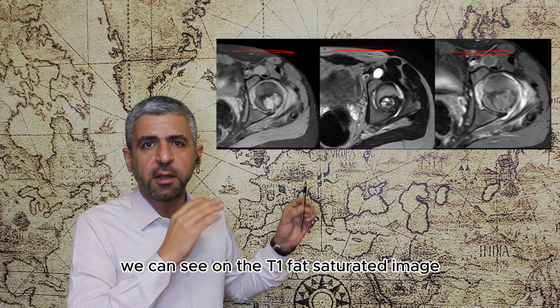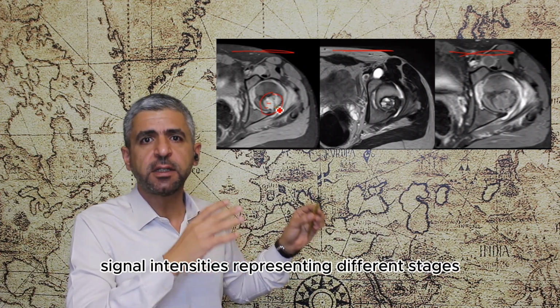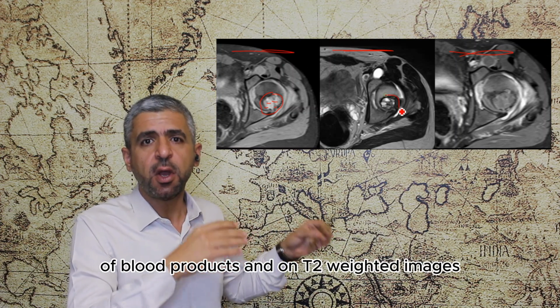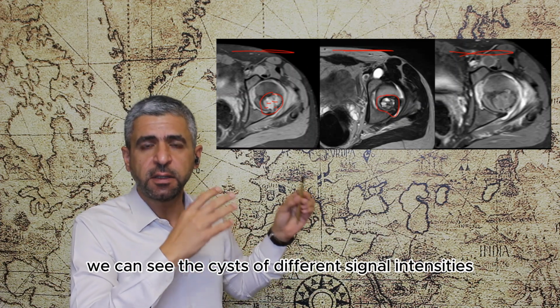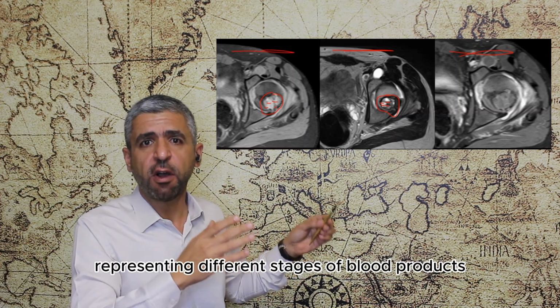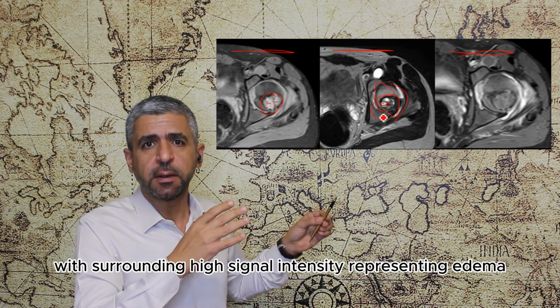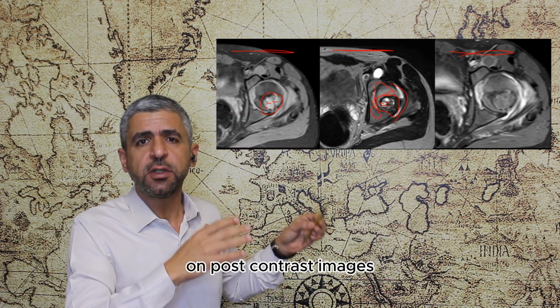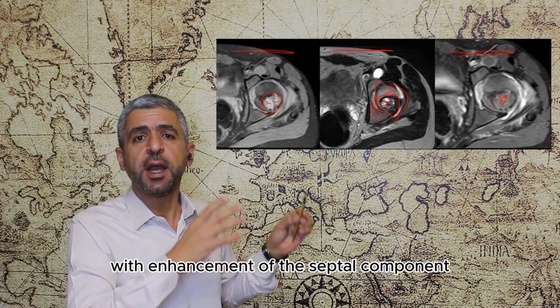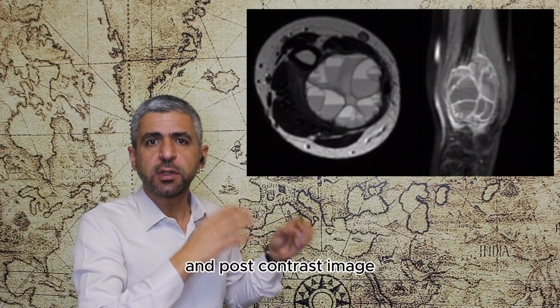We can see on the T1 fat-saturated image the cysts of different signal intensities representing different stages of blood products, and on T2 weighted images we can see the cysts of different signal intensities with multiple fluid levels representing different stages of blood product with surrounding high signal intensity representing edema. On post-contrast images, we see no enhancement of the cystic component with enhancement of the septal component, giving a honeycomb appearance.